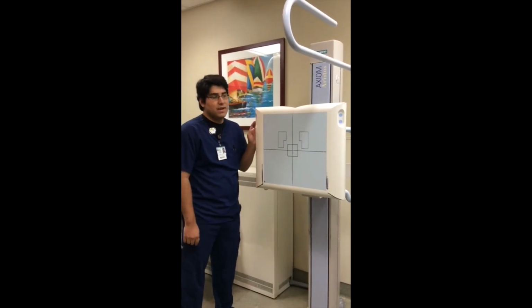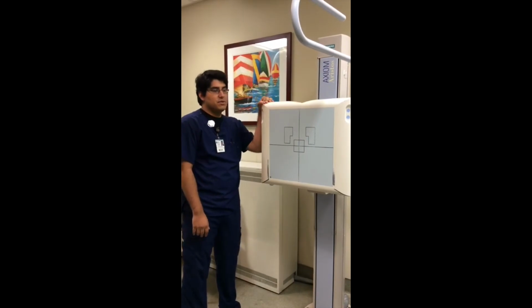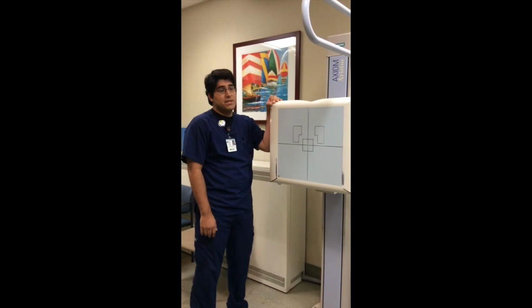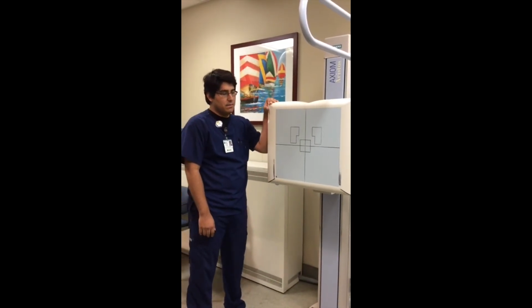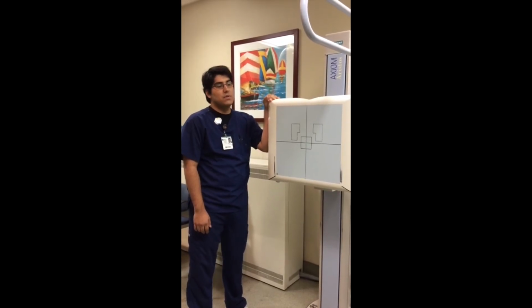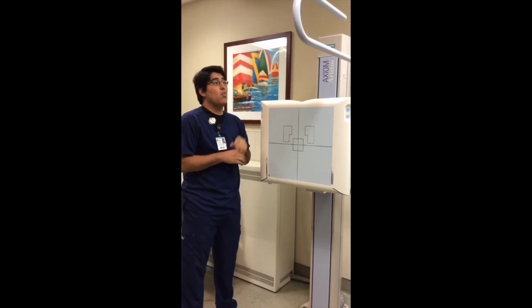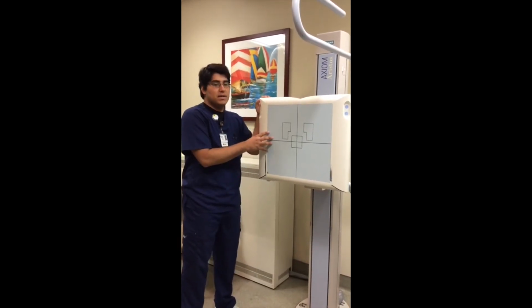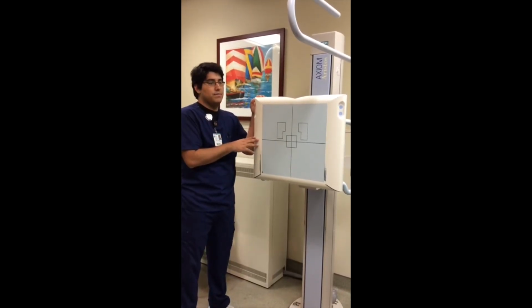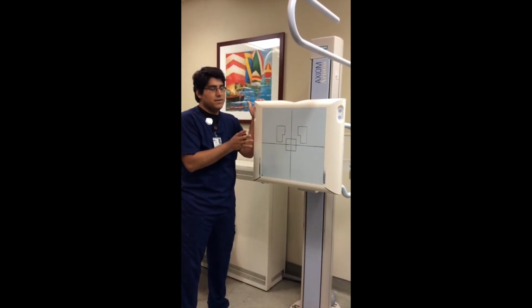Okay, so the last thing we're going to talk about when we talk about AEC chambers is basically how, I guess, the machine interacts within itself. First thing is you have what's called the minimum response time. Usually this is set at, I believe it's 0.001 seconds. Basically what that means is that that's how long, once the chambers are ionized, how long it takes for the chambers or the detectors to tell the system or the tube to cut off the exposure. It's a very simple concept.